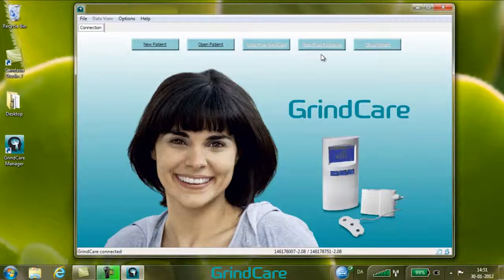Data from Exchange. This is used for appending patient data from an external file received by email through the GrindCare Exchange program to the active patient file. Close Patient. To close the current patient file.